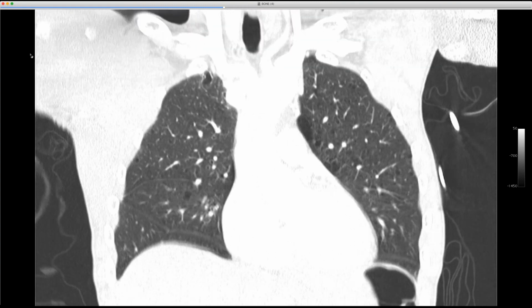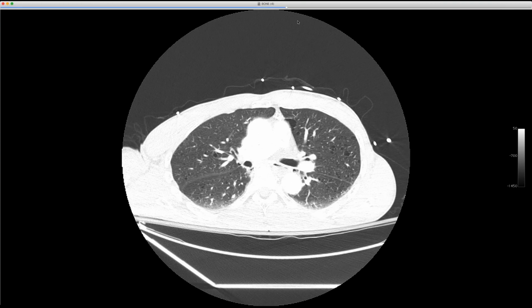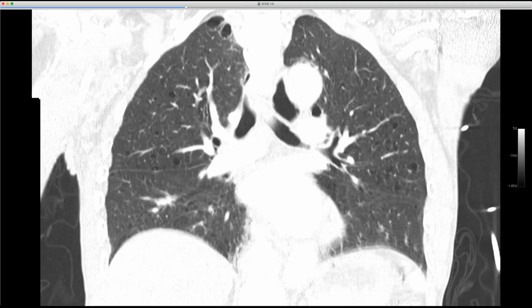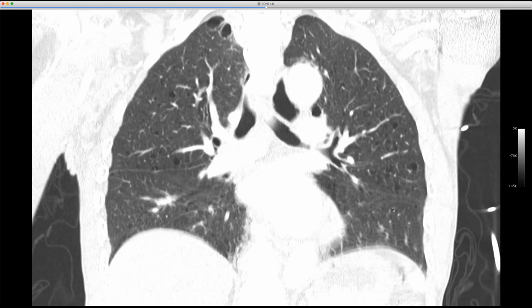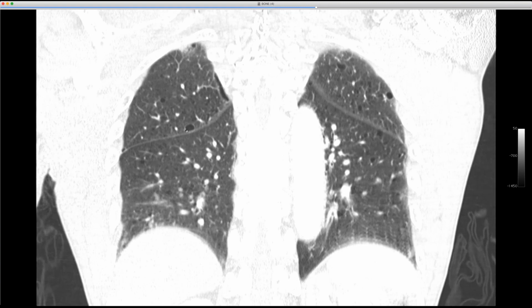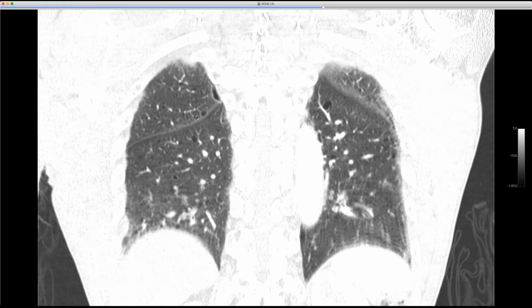Jeff, is it a boy or a girl? Good question. It is a girl, but I don't think that makes a difference. Well, for Sjogren's it might, but I don't think for LCH it makes a difference anymore. But you have to bring up LAM if it's a female. I didn't like them for LAM. I thought they were too upper zone predominant. I mean, you really don't see a lot of cysts down in the lower zones. You see a whole bunch on any given coronal slice. And there are some lesions that sort of blend with emphysema too. So I prefer Langerhans cell too.